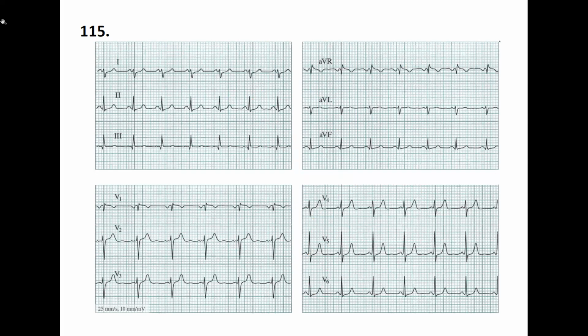Okay, so this one is regular, rhythmic, and we can see P waves present before each QRS complex. For the heart rate, we have 4 squares, so it must be around 75. A little bit more than 75 because it's less than 4 squares, between 3 and 4. It's still normal, but maybe it's 90 or 80 or something like that.